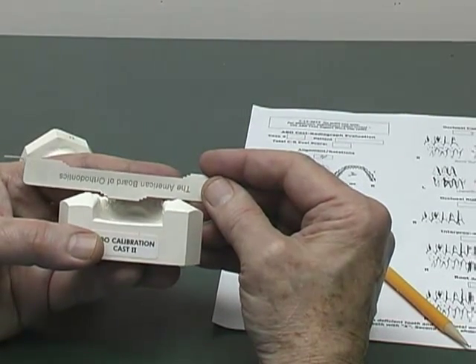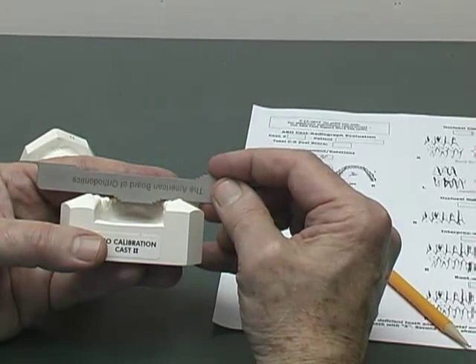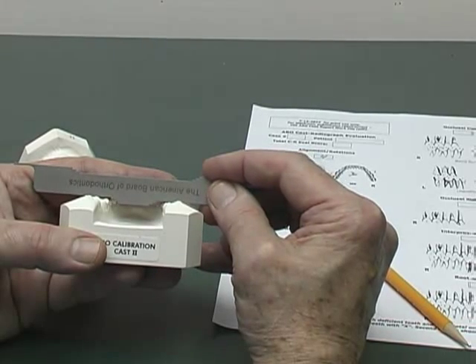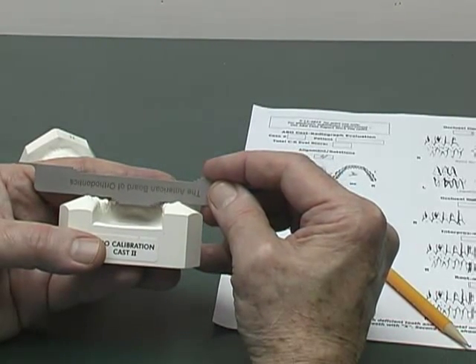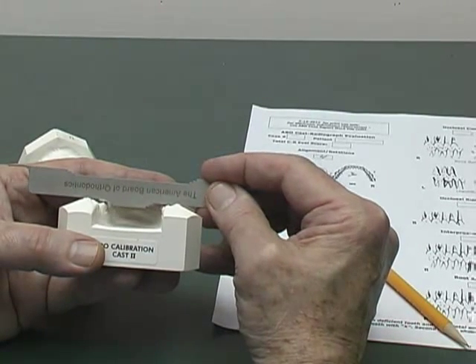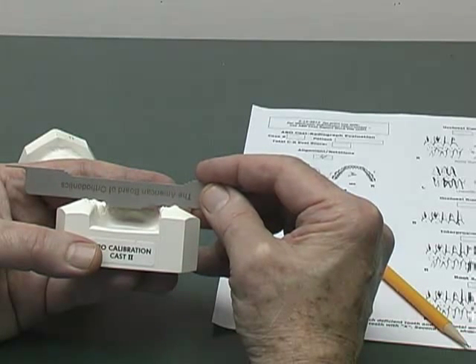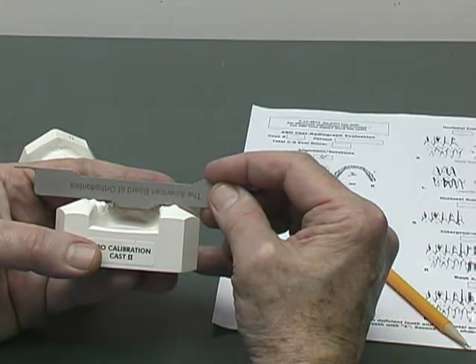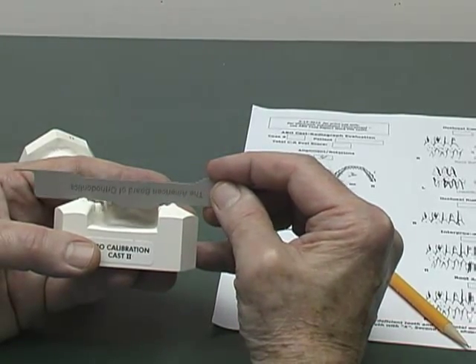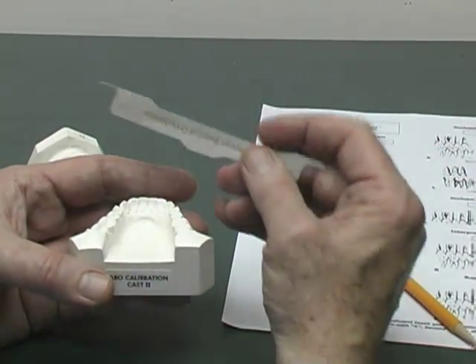Moving forward, we would place the gauge over the mesial buccal cusp tip, and it looks like the left side is greater than 1 millimeter for both of those cusps, so 1 point. Yet the right side cusp tip also is 1 point here. So both of those first molars will receive 1 point scores.